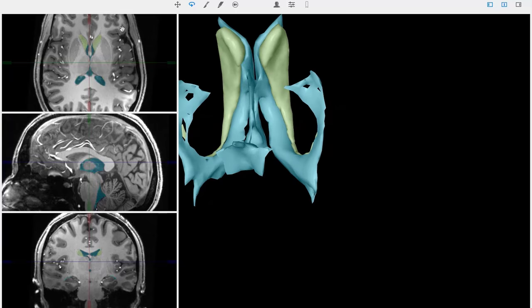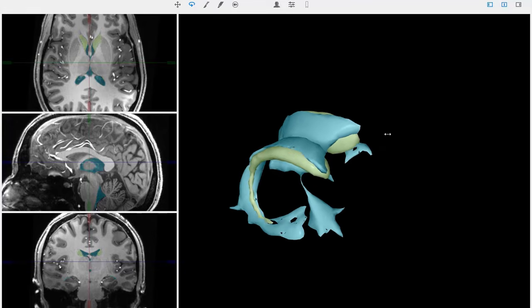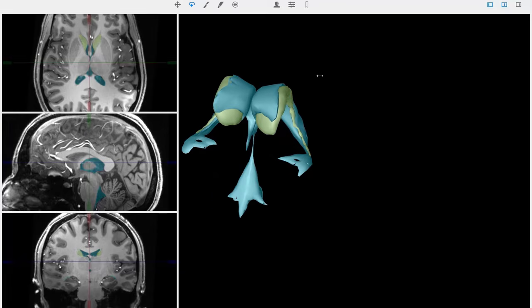Remember, when you're looking at an axial MRI, you're always imagining that you're at the foot of the bed looking up at the patient as if they're laying in a bed, their feet are towards you, and you're looking up into the brain. So this is the patient's right hemisphere, this is the left hemisphere. When you're looking at them coronally, you imagine that you're looking at your patient face to face. This is the right hemisphere again, this is the left hemisphere.